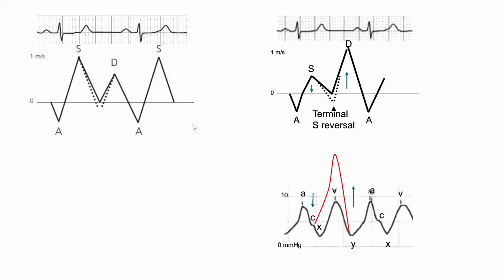Now I will describe the pathology of pulmonary veins. And here is what happens in pathology. If you have high left atrial pressure, you get a big V wave. A big V wave is the epitome of elevated left atrial pressure, okay? Epitome of decompensated heart failure, systolic or diastolic. People think MR, but most commonly a big V wave is heart failure. So you have a high LA pressure, you get a big V wave.